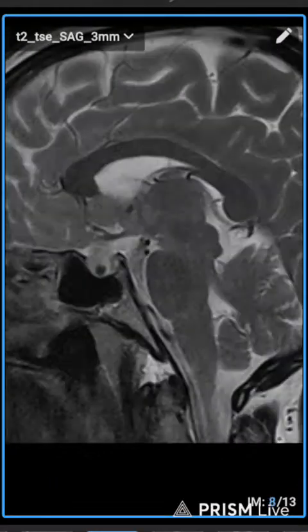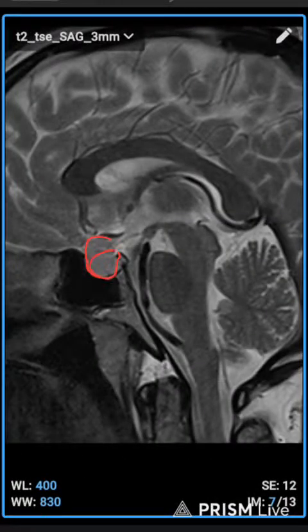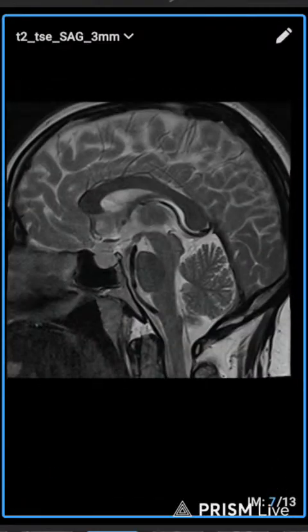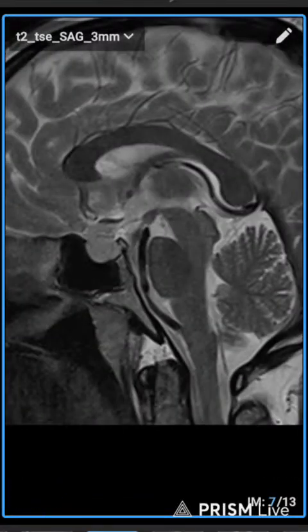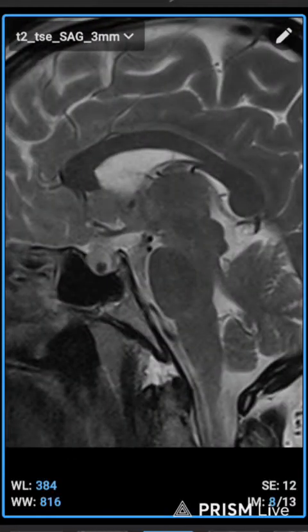It's properly showing in this sequence. The area of the pituitary is this, but in this patient, this is the enlarged area of the pituitary. It's a tumor in this patient, so it's more enlarged. According to the normal scan, it's more enlarged.